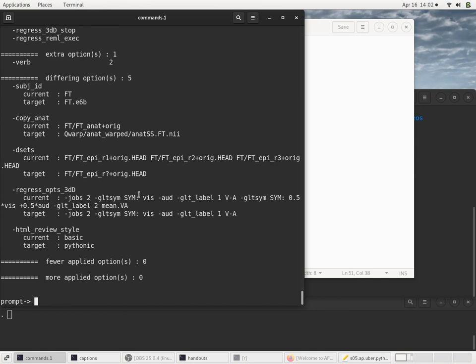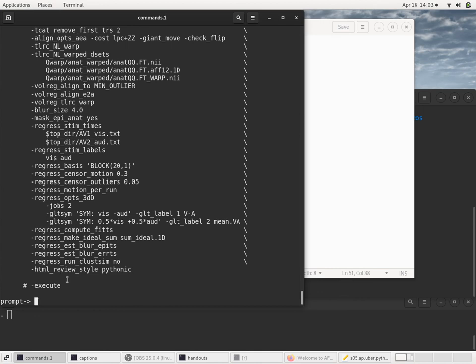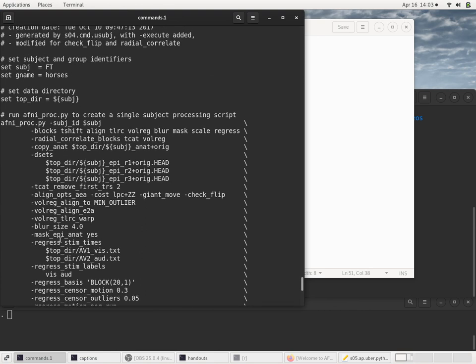If you're going to really compare your example against one from a different script in your lab, for example, then you might use something more complex. Did I put that in this one? If I cat this file. Yeah. So this is more what you could do if you wanted to compare two full commands that are scripts in your group, say.